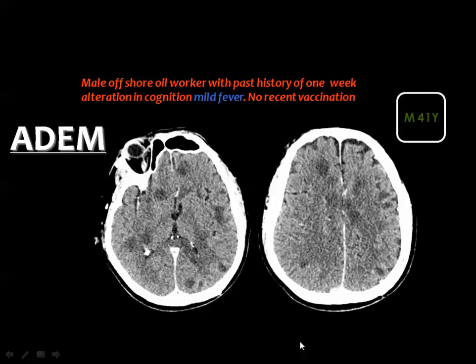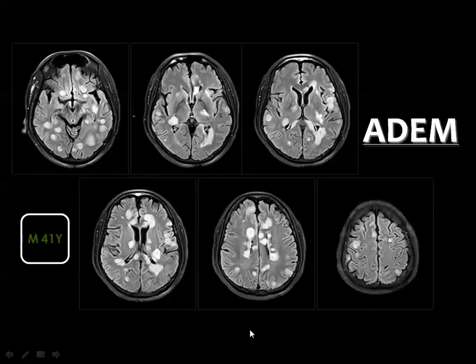And this is the case of ADEM, in a 41 years old male who had the past history of 1 week deterioration in cognition and mild fever with no recent history of vaccination. The CT brain scan after contrast enhancement showed multiple patchy areas of low hypodensity scattered in the deep as well as the superficial white matter of both cerebral hemispheres.